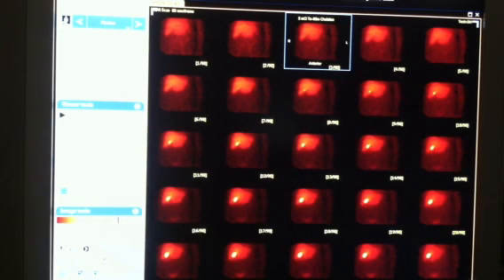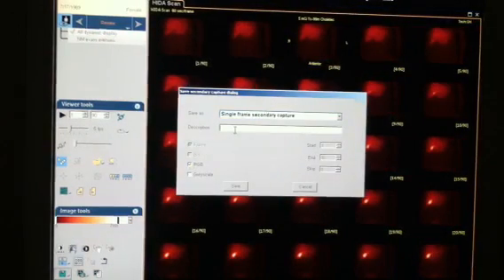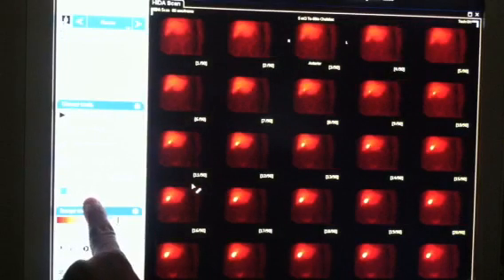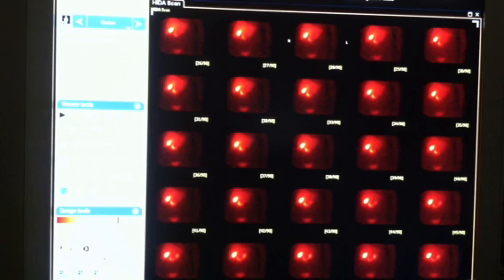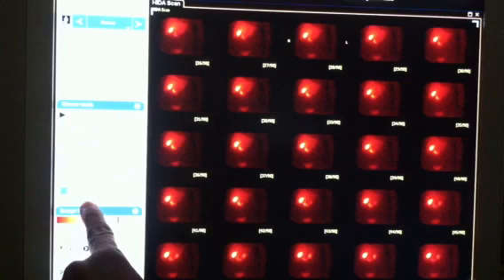So we're going to come down here, secondary capture, RGB, and we're going to call this Hida 1, and save. Now from here, we're going to use these arrows here to go to the next page. Boom, next page. We're going to put Hida 2. Hida 2, save. Go to the next one here.